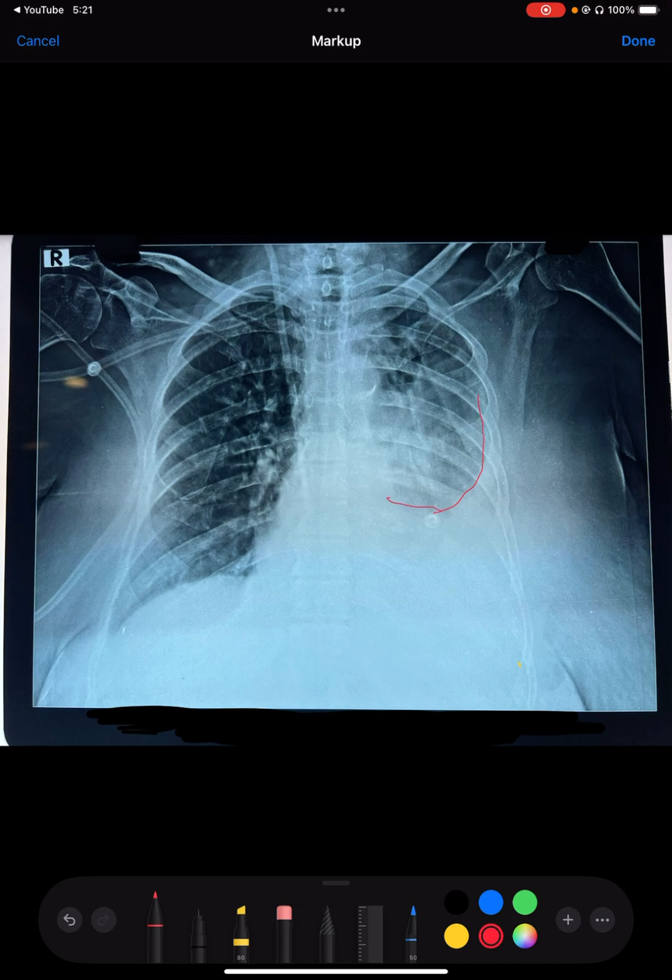So this is a pure pleural effusion or accumulation of water that is going along the costal margins. So this is a very classical pleural effusion where at least the consolidation or pneumonia patch is not visible. That may be visible only on HRCT chest. On CT scan chest, we can see that patch which can very easily be identified, or we can simply tap this pleural effusion, and if the fluid goes off, maybe we'll be able to see the pneumonia.